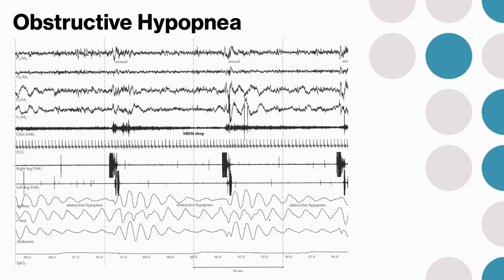Here you can see normal breaths and airflow during N1 because these are slow rolling eye movements. There. So this is N1. That kind of looks like alpha. It's kind of thick for me though. The more they fall asleep, we've got nice big breaths, but their airflow is going down and it's flat until they arouse. There's the arousal. Chin tone goes up for that arousal and the legs kick for that arousal. You also have a desaturation from 97 to 88.